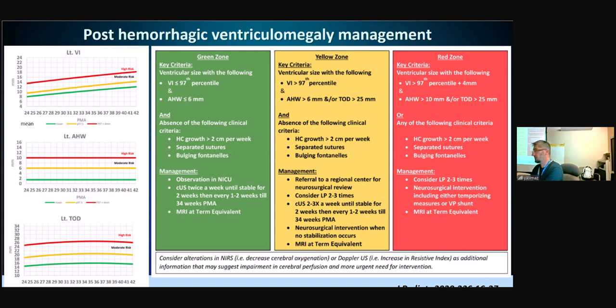You just say there is hemorrhage in the ventricle, that's what matters, because if there's hemorrhage in the ventricle, it means that it may obstruct, it may cause hydrocephalus. So they will continue following up. If you say that there is no hemorrhage in the ventricle, they're relaxed. They don't have to do repeat ultrasounds and follow-ups.